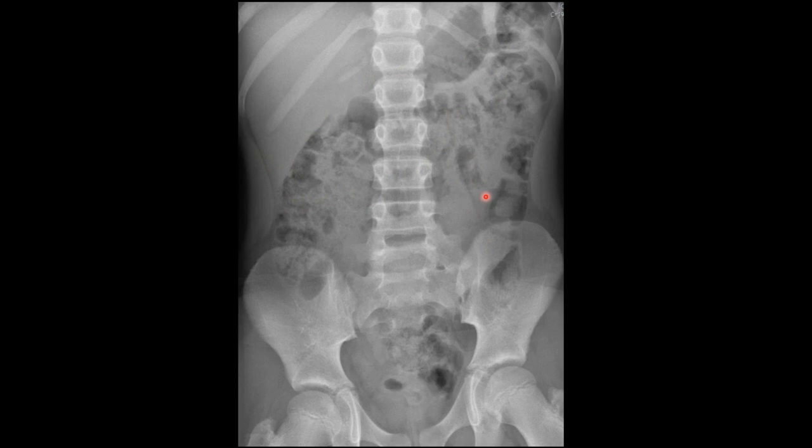And then finally, we're going to the bones, and it is important to check because sometimes certain bony pathology can cause lower back pain, abdominal pain. And this patient here, on the face of it, looks absolutely fine, but we do have some partial sacralization of the L5 vertebra here. Typical symptoms with sacralization is you can get pain in the gluteal region and lower extremities, loss of skin sensation in the thigh and lower back, and localized pain. So a patient presenting with lower back or abdominal pain, occasionally it could maybe be due to some bony pathology. So always important to point that out.